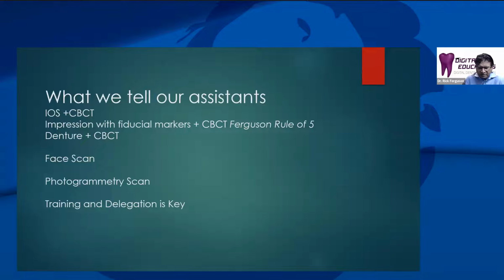Although IOS has gotten much better, and I know some folks using just IOS, there are certain parameters that you have to be careful about. And of course, you have to verify the fit of your appliances. And again, that goes back to using a verification jig.